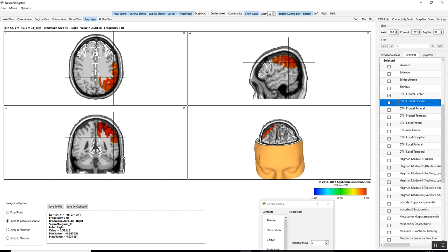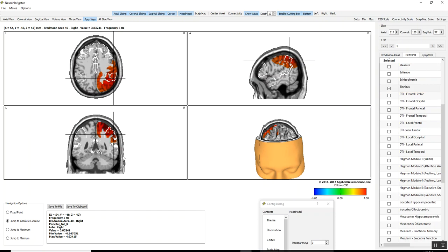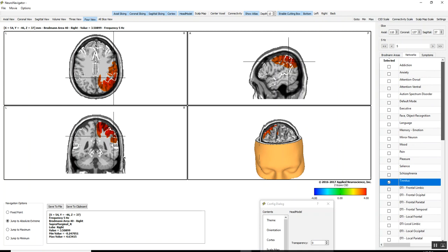And then there's also a diffusion tensor imaging atlas that you can evaluate. Frontal atlas, the occipital, etc., based upon the Catani and Thiebaut de Schotten diffusion tensor imaging atlas. You can look at tinnitus, etc., and evaluate the deviation from normal with patients that have tinnitus, identify those nodes that are most deviant from normal, and then use neurofeedback to reinforce those nodes towards a greater stability and efficiency as one evaluates the severity of the symptoms. The goal is to reduce the symptoms.